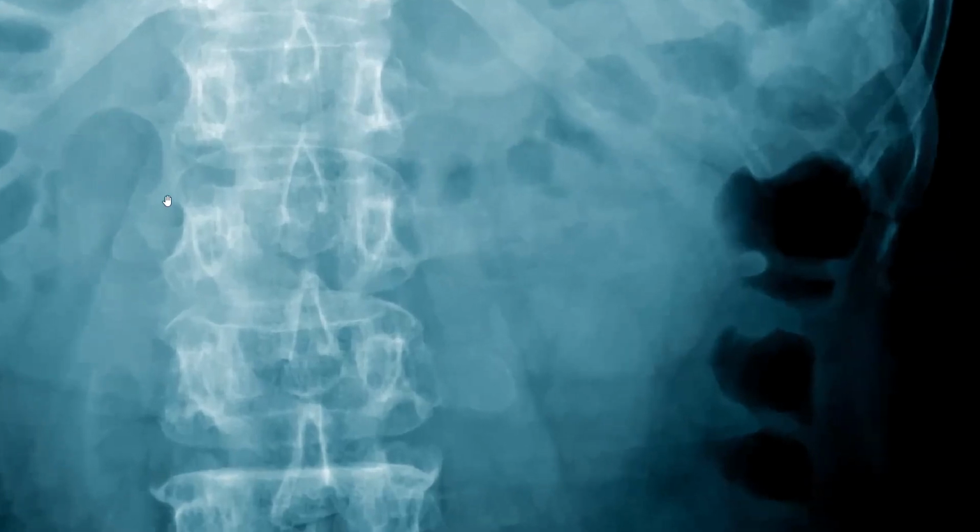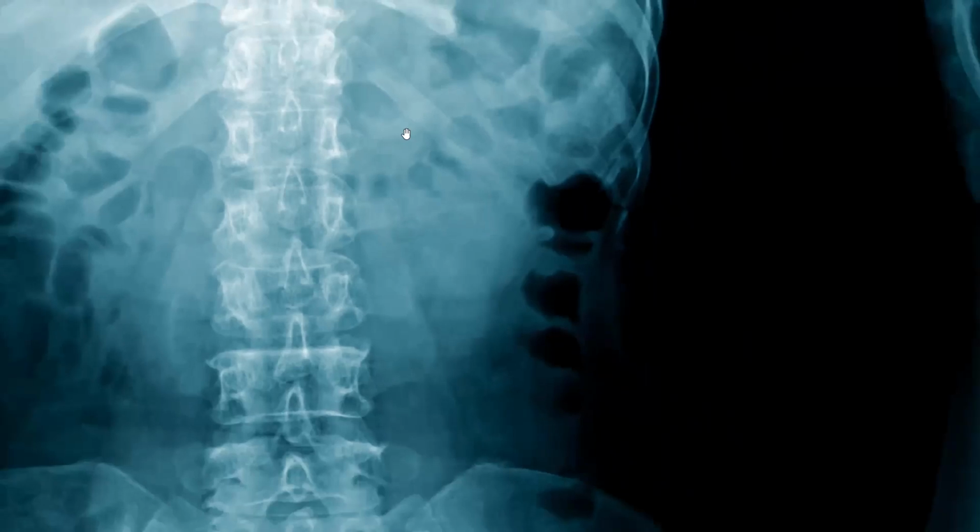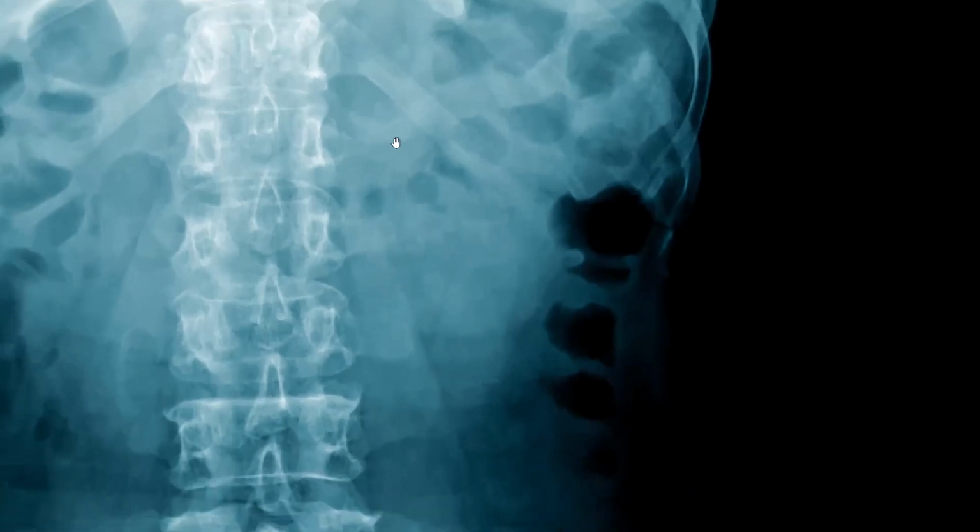Here you can see this is the transverse colon, okay? And here you can see the bowel wall like this. It's, again, a couple millimeters in thickness, okay? It's outlined by fat on its outer margin, luminal air, so that's why you're able to see it, okay? Here you can see the outline of the wall of the stomach, okay? The greater curvature of the stomach, okay? Lesser curvature is outlined here.